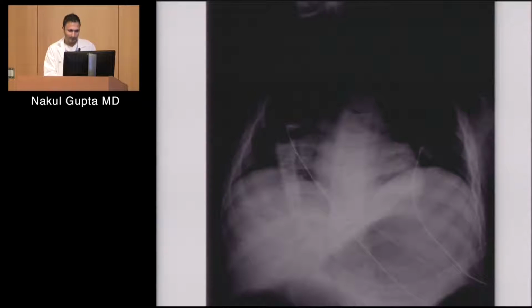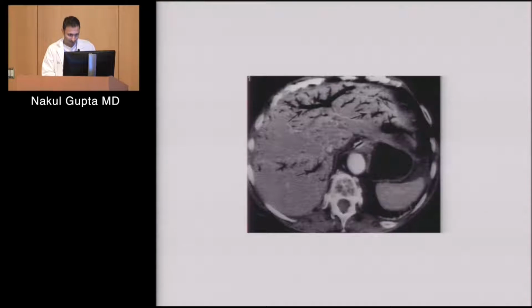All right, another radiograph here. Let's take a look at that for a sec. Let me see what's next.